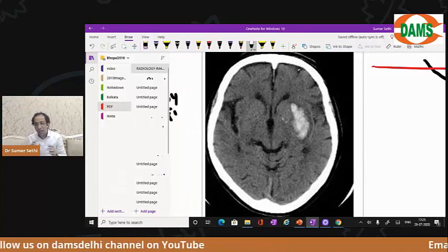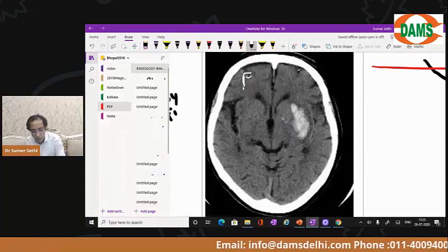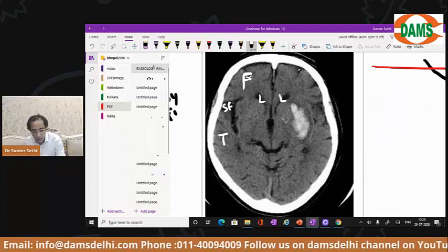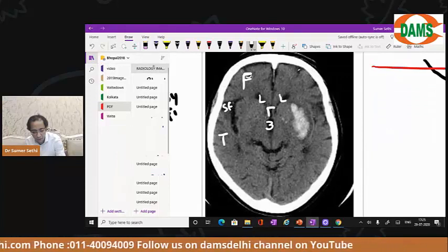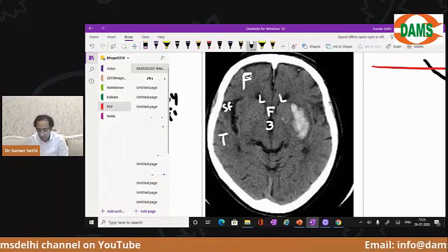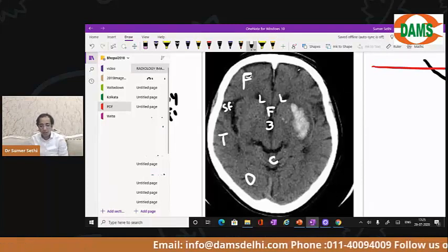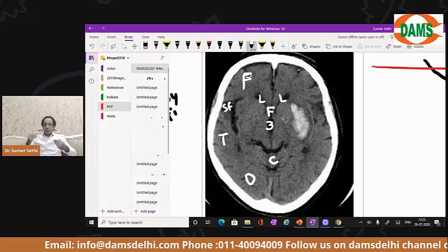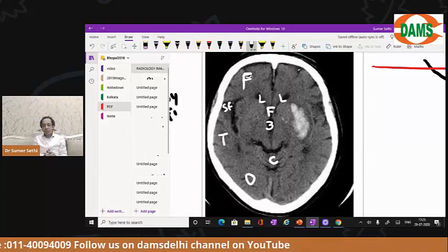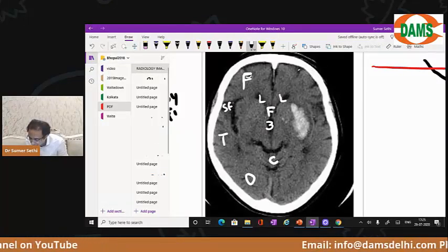After finishing the brain anatomy we'll take a break, but just make sure that we understand the anatomy in one go. Frontal lobe, temporal lobe, sylvian fissure, lateral ventricle, third ventricle, fornix. If somebody wants to take a picture, this is the picture we need to be taking. Frontal lobe in front, sylvian fissure behind it, temporal lobe behind that, occipital lobe at the very back, and we can still see a little of the superior part of the cerebellum. We can see the third ventricle, the lateral ventricles, and the fornix in the middle.